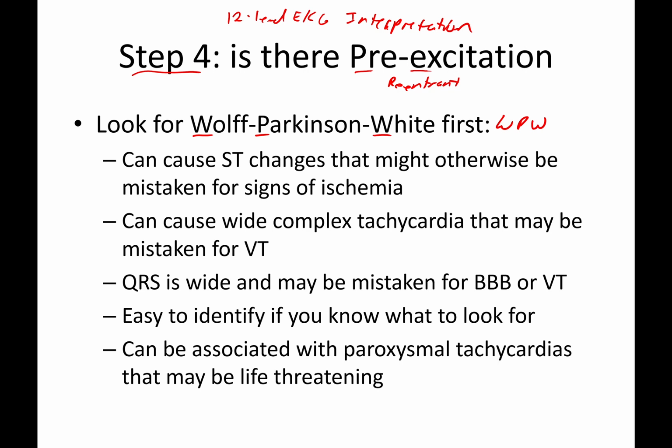And those natural changes that occur with that can be mistaken as other things. Specifically, we're worried about ST changes that occur because you might think that it's ischemia, but in reality, it's due to the re-entrant rhythm. The other one to worry about, the ischemia. So you're thinking about maybe T-wave inversion or ST elevation or depression can occur. But that, again, is due to the re-entrant rhythm.